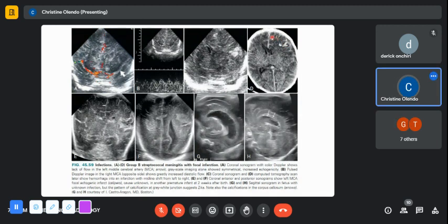This one, yes? Extra-axial. Go towards the... yes, there. What is that fluid there? There's something subdural. Go more anteriorly. Can you see that? Yes, there. You can see the surface of the brain?